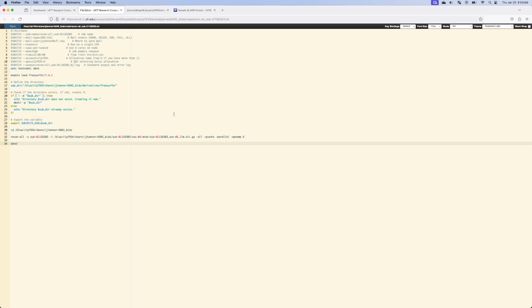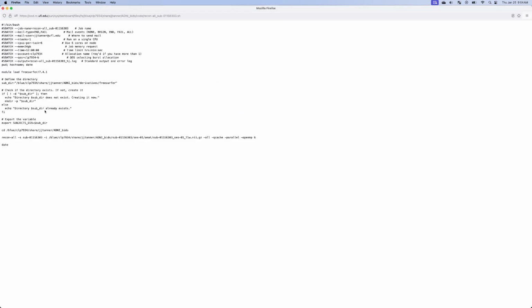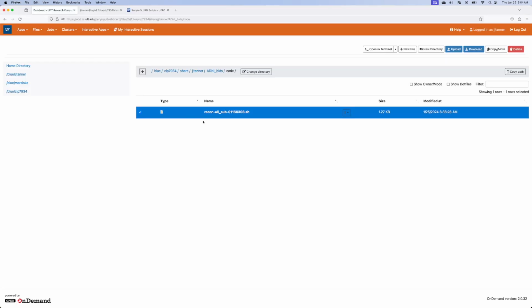But again, I really will recommend just downloading the script, editing in something like Visual Studio Code, and doing that, because that'll be a lot safer. So if you're going through the browser, save things elsewhere as much as you can. And just to verify, we have the new ID, this is the new path, and it was saved. Okay, so now that's only one participant.